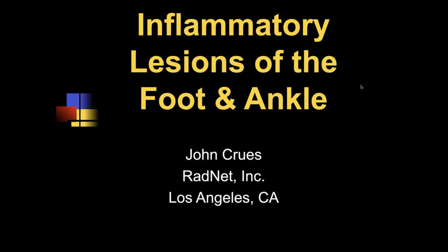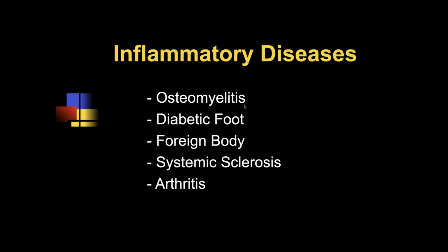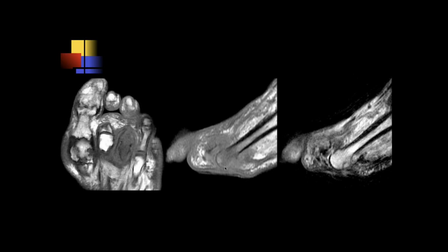Okay, so we'll go on here and talk about inflammatory lesions. We'll talk about osteomyelitis, a diabetic foot, foreign body, systemic sclerosis, and then about arthritis. So, Ashley, what do you think of this case?